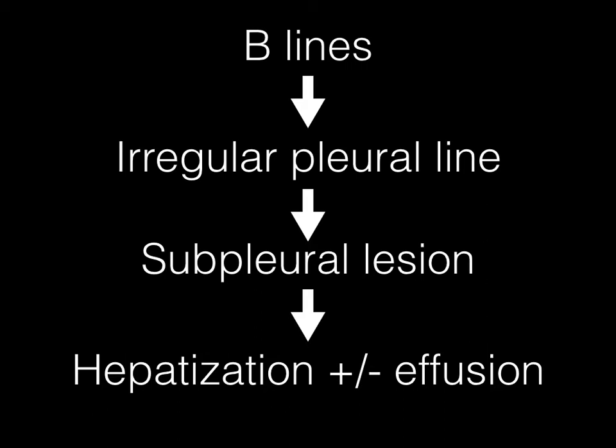We're not going to be getting into the data in terms of, well, is this a viral pneumonia? Is this a bacterial pneumonia? Are we talking about pediatrics? Are we talking about adults? What we're looking for in this next little bit of discussion is the lobar pneumonias, the ones that if you got the x-ray, you'd be like, hey, that's a giant lobar pneumonia. When we get together, we'll talk a bit more about the nuances. But again, if we're thinking big lobar pneumonias, this tends to be the way that they progress.